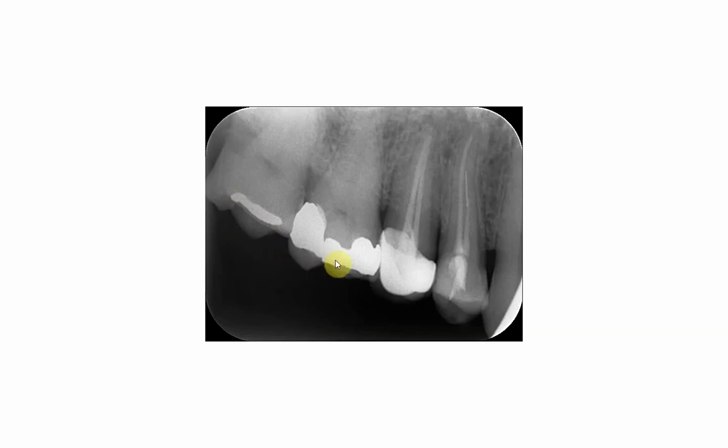if you compare it to the MOD amalgam filling, you will see that the radio opacity is much more in the amalgam filling, and you can see that the amalgam is extending from the mesial surface of the upper 6 to the distal surface, and underneath the distal filling box of the filling you will see a material that has a lesser radio opacity than the amalgam filling, and this is the lining material, zinc phosphate cement, which is used here. You can't see it in the other parts.